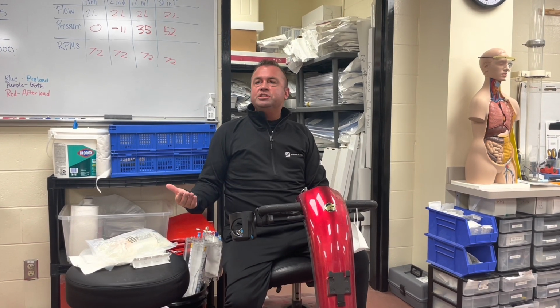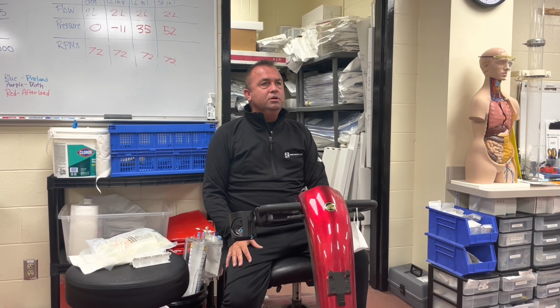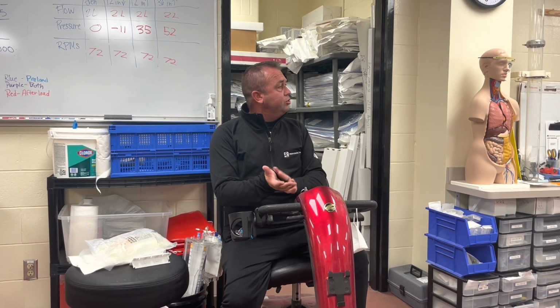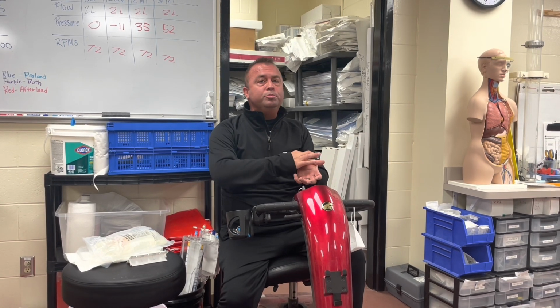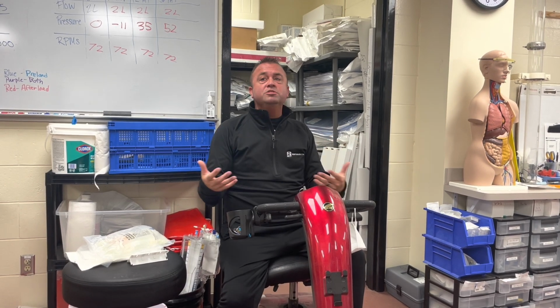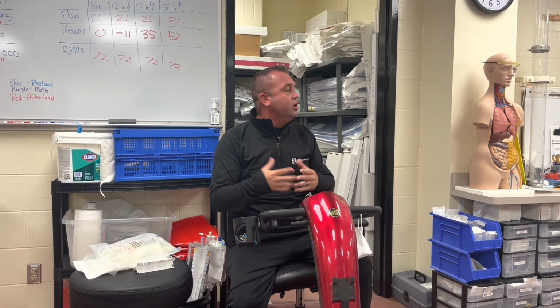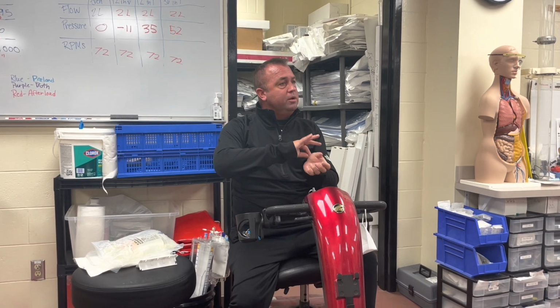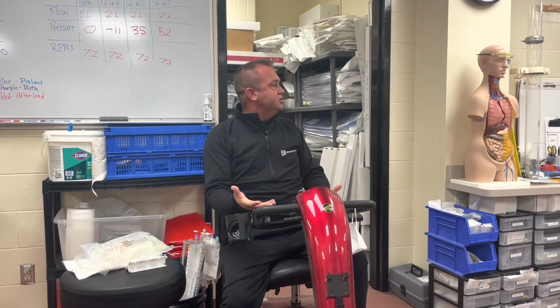Where do we measure pressure off of our patient? Where's the most common place that we measure arterial pressure off of our patient? Anybody know? Radial. The radial, either the left or right radial, depending on the case. The radial has very good access. You use an arrow catheter, you put that catheter into the radial artery. I personally have done thousands of radial artery insertions for pressure at the heart hospital there. We would insert those lines. Then you connect a hard, rigid pressure tubing. From that, it goes then to our transducer here, plugs into the monitor, it gives us a pressure reading.